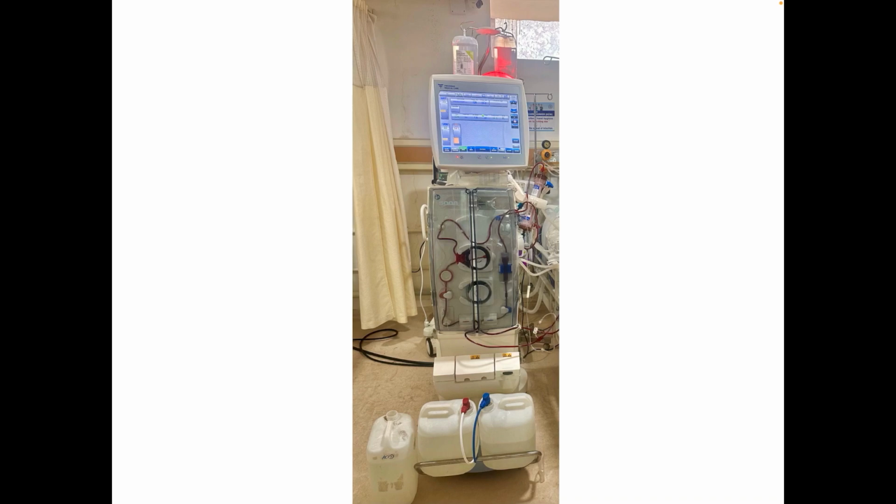Today, I am going to tell about the hemodialysis machine, its functioning, the principle mostly, its parts. So, the hemodialysis machine, this is a Fresenius 5008 machine, which is basically a SLED machine, sustained low efficiency dialysis. So, the basic components, whether it be a SLED machine or a normal dialysis machine, are the same. I would like to tell you about the components.